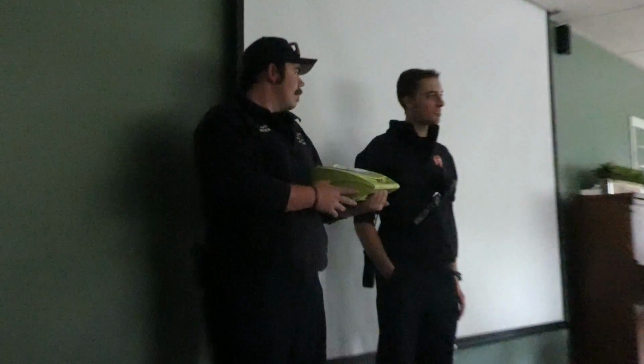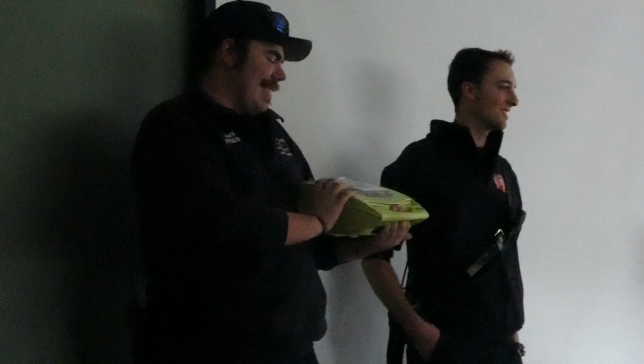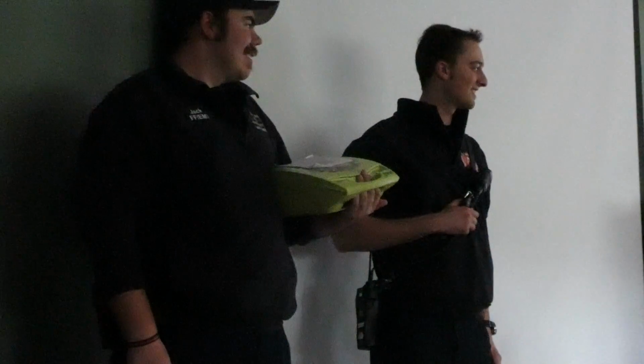Alright, so do you guys know when you need to use an AED? Somebody's having a heart attack. Let us know. No, we don't know. Yeah, like it's almost too late. Assume we don't know anything. Start at the beginning, Austin.